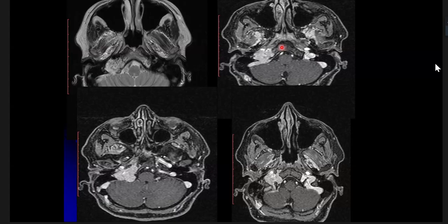Very good. So basically, you have to differentiate jugular lesions. Most important hint it is paragangliomas, then schwannomas, third is meningioma. Fourth is, of course, hypervascular metastasis, but we will see more expansion, more of the destruction, associated soft tissue, multiple lesions. We have known history, and the epicenter would not be a jugular foramen, either it would be something in the CP angle or something in the bone.